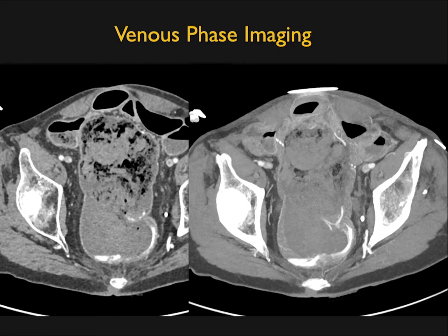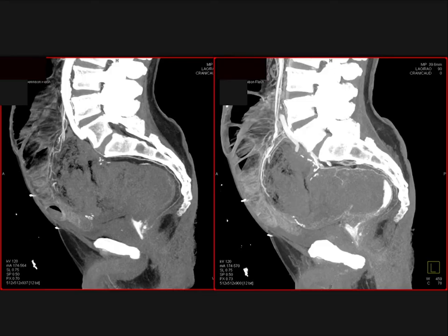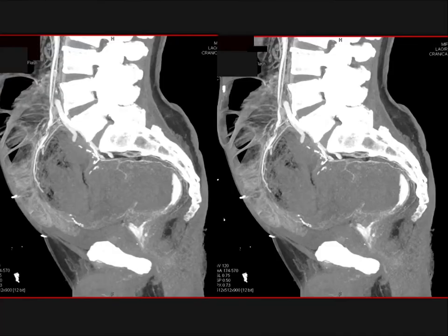But now you know which hemorrhoidal vessels are involved, and you may embolize anyway. Just a really nice example showing you some of the challenges we run into. But again, CTA really increases your confidence. There's no way this could be artifact, of course. There's no misinterpretation. There really is no issue.